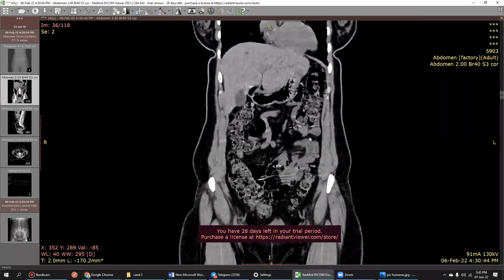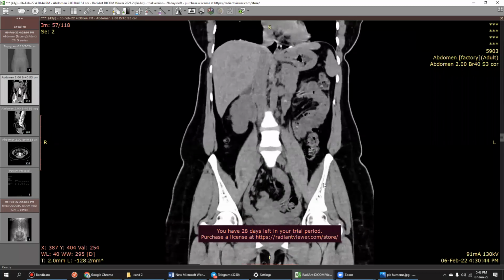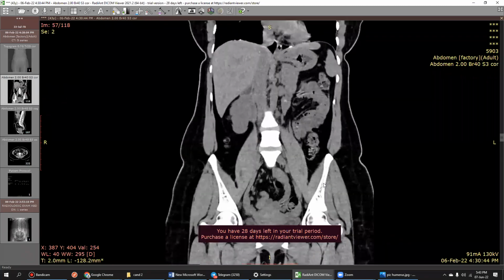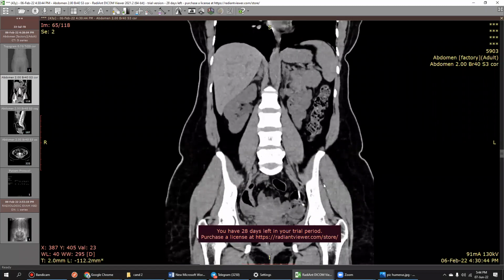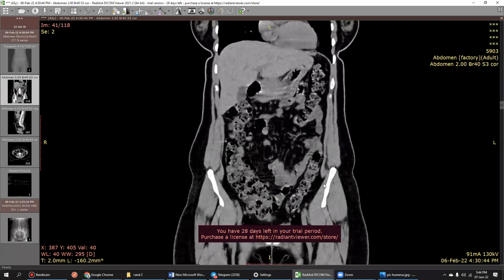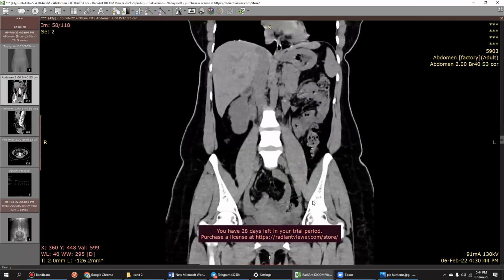Okay. So I'm provided with the coronal images. The patient has left side abdominal pain. The solid organs are unremarkable. And looking at the descending colon, ascending colon, transverse colon, all appear unremarkable. The pain is more specific to the left iliac fossa. Yeah, I'm concentrating more on the left side.